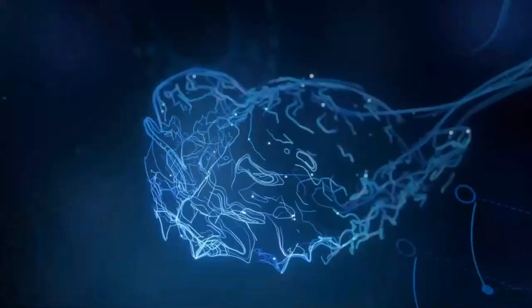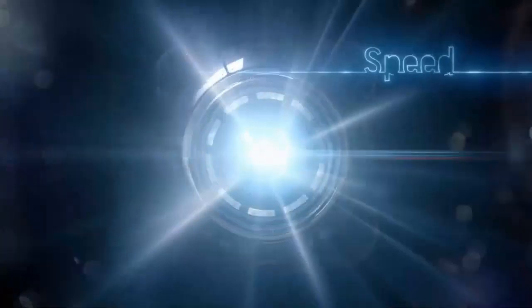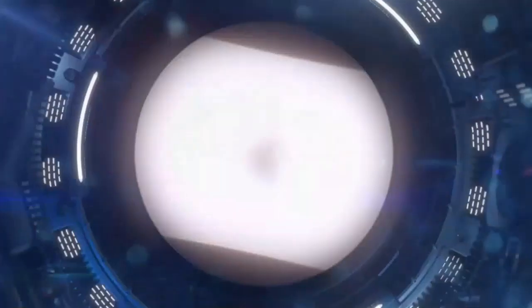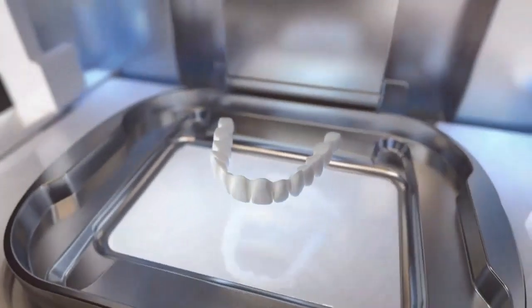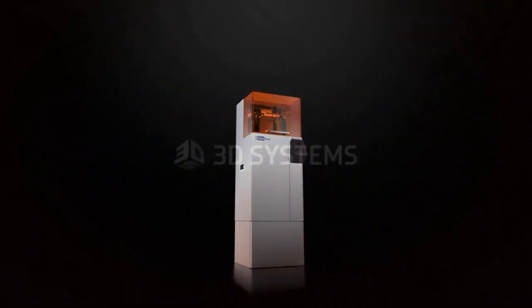This immediately showcases a new feature for the new 3D Sprint release, the automatic push notifications when there are new material database patches available. For example, new build styles and/or new support styles. During this webinar, we will show you the most important new functions that are applicable for our NextDent 5100 users. We will cover some software functions, build and support style changes, and of course the new main features of this release. All these developed specially for our customers to improve the daily workflows and increase production on your NextDent 5100.